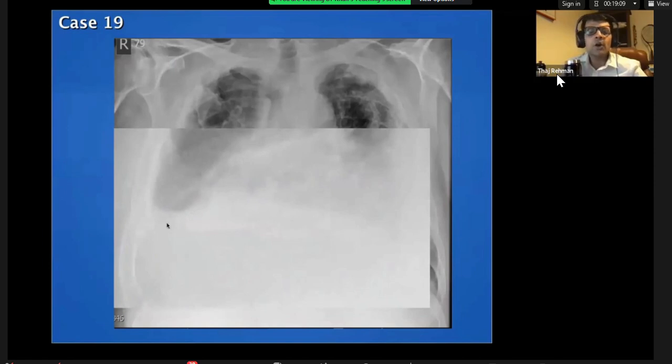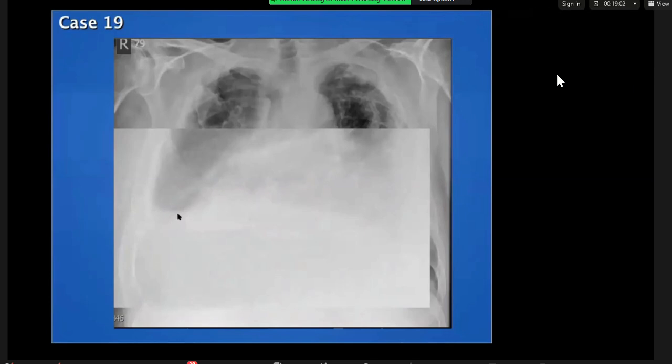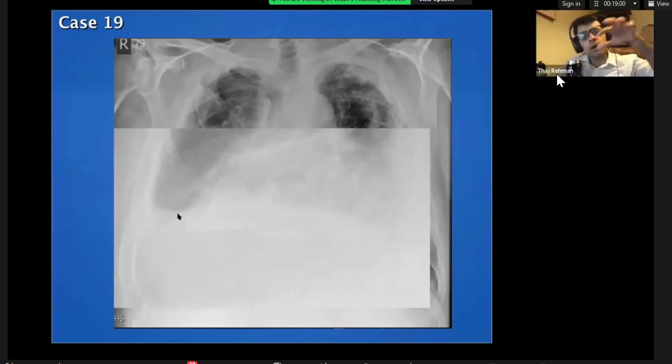The diaphragmatic pleural calcification may not be along the dome of the diaphragm, because if you imagine the diaphragm, it's not a uniform round structure. It has got its undulations. Especially when there is a calcified pleural plaque sitting at one part, that part may not go up and down. So the diaphragmatic white line of calcification may be projected in front of the diaphragm. Yeah.